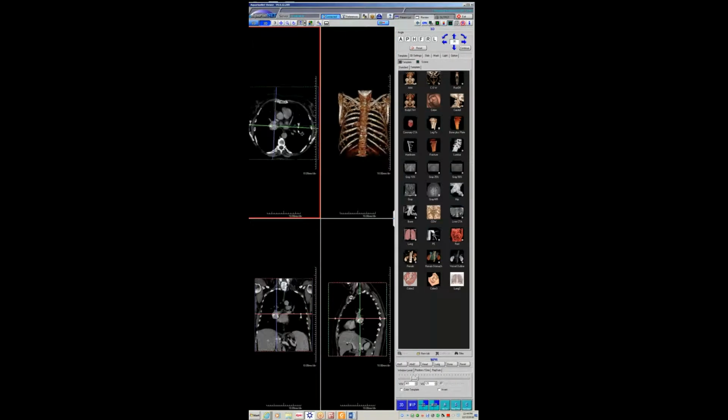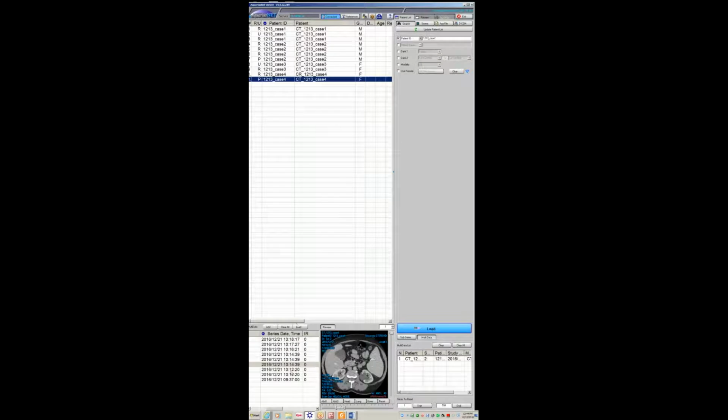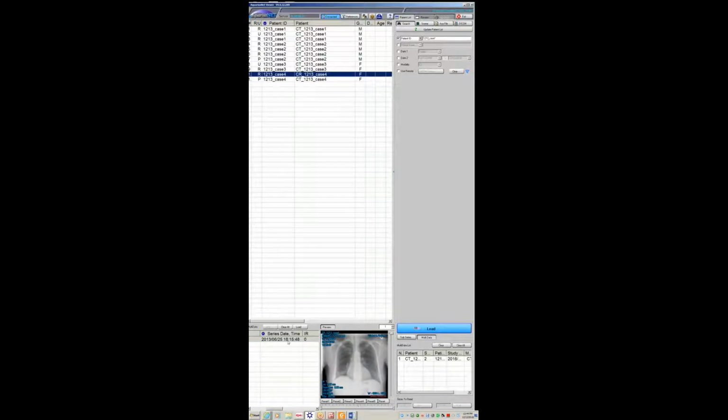Okay, we don't have a non-contrast study to see how much calcium there is. Yeah, we do. I just wasn't going to include it. I do have one. You should be able to see some of that calcium on the radiograph too. Yeah, you can.